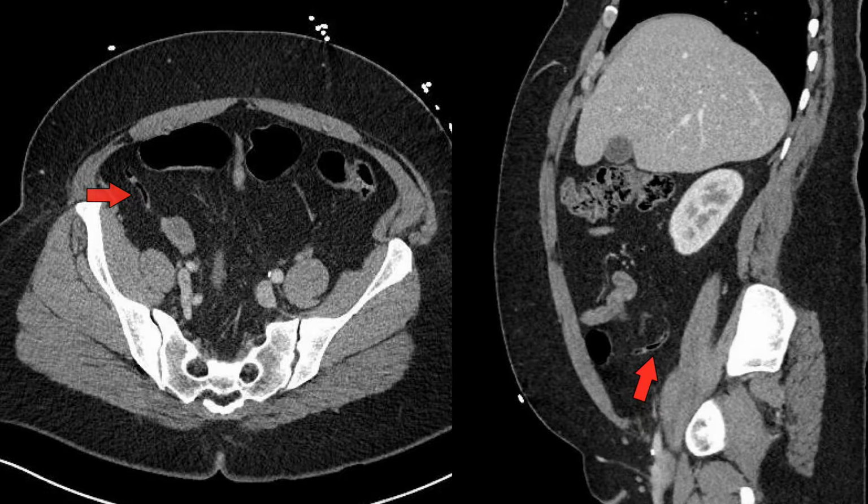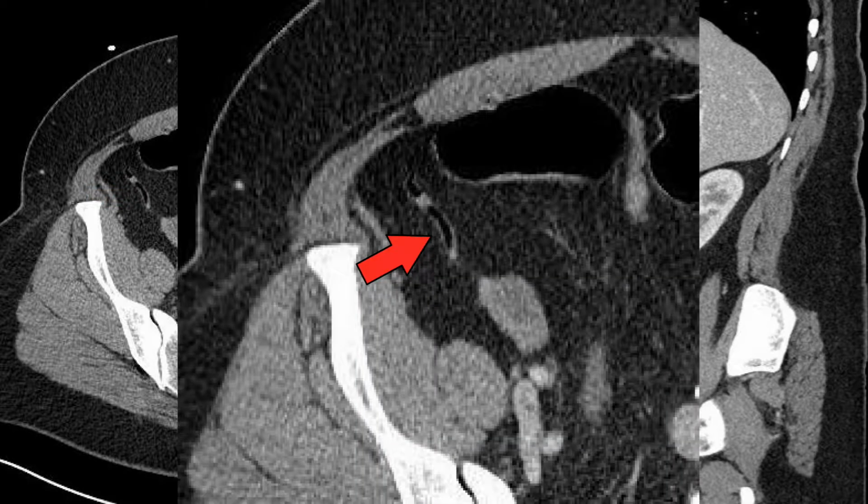So what is the radiologic appearance of acute appendicitis? Well, as I mentioned in my X-ray and CT videos, abdominal X-rays aren't terribly helpful because of their relatively poor soft tissue contrast. So CT is generally the go-to imaging for appendicitis. Here's a CT of a normal appendix. You can see that the appendix is thin and air-filled, and the surrounding fat is relatively clean.